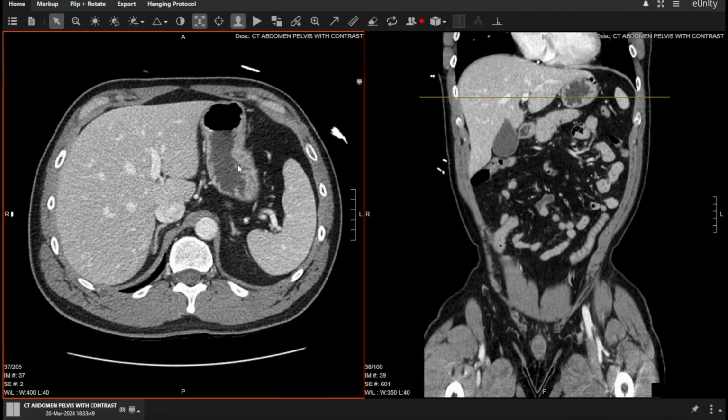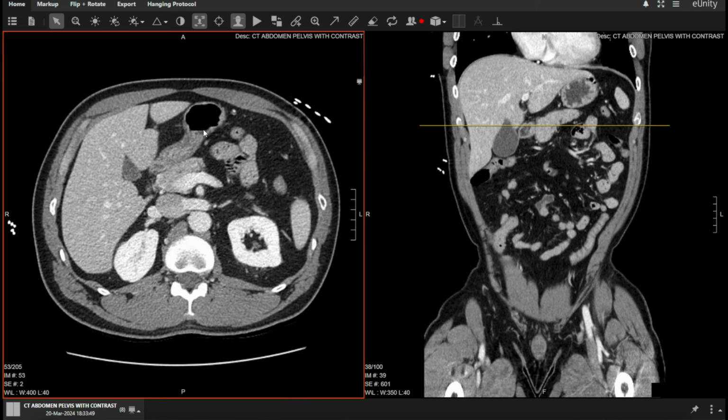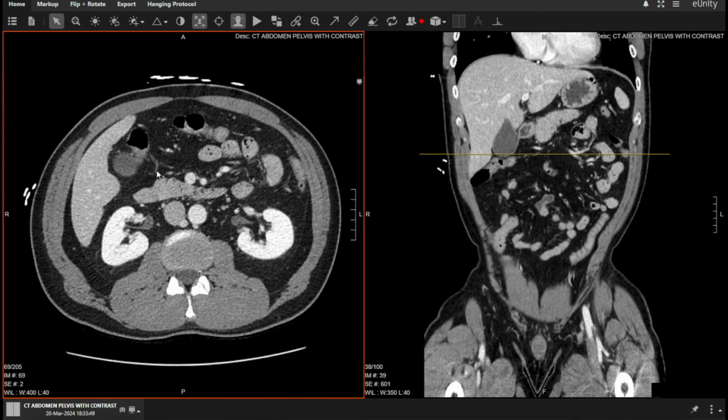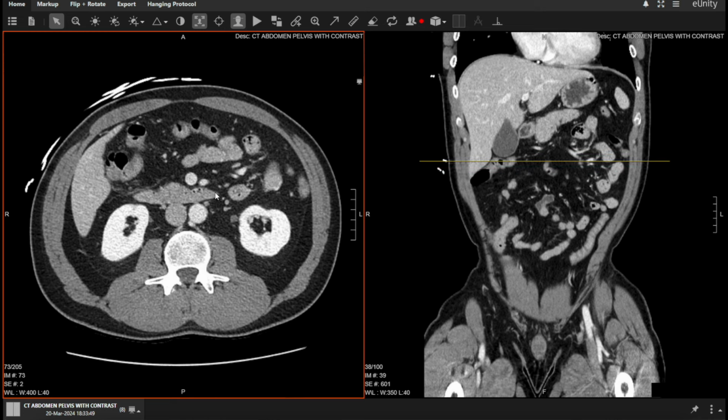So the stomach crosses from the patient's left side to the right side, where the pylorus becomes D1, or the first part of the duodenum, which is right around here. And the duodenum makes a C loop. It'll run here and then across, unless the patient has malrotation. Every patient's duodenum should go from the patient's right side across to the left side. And so we can follow it here. Right here is the duodenum coming across this way.